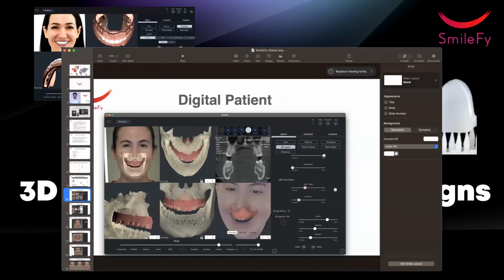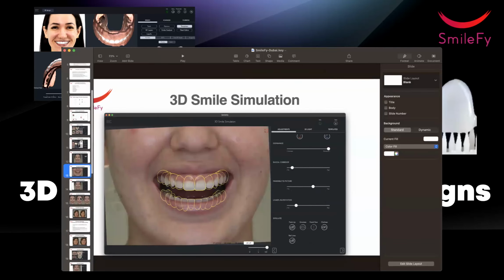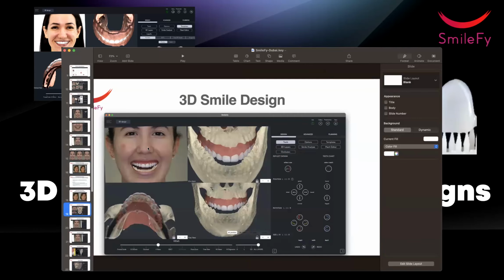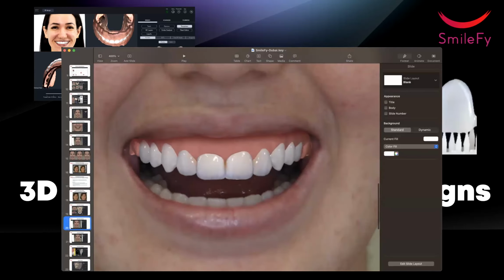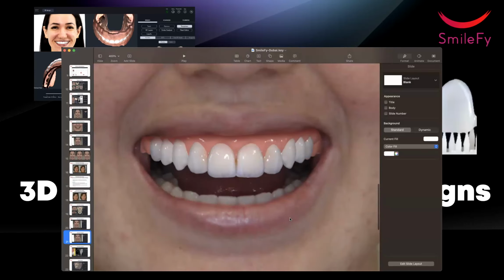Then you import the CBCT, we segment the CBCT, you STL bone in the planning, and then you say, okay, maybe I readjust my design, and instead of the design that I have initially, we are gonna create a new treatment plan digitally first, and we will create a new design with a crown lengthening treatment plan.